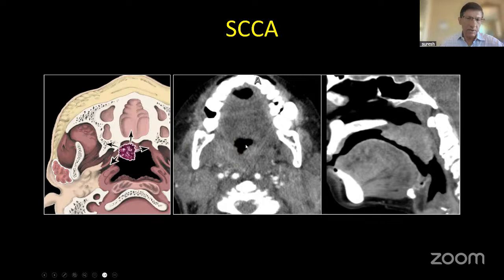We can see maybe there's a little bit of airway narrowing here. Notice how the carotid artery is extending into the retropharyngeal space. So this is information that I include in my report. But on the sagittal images, we can see there's no ambiguity regarding this soft palate carcinoma. So this right here is pretty easy to see.